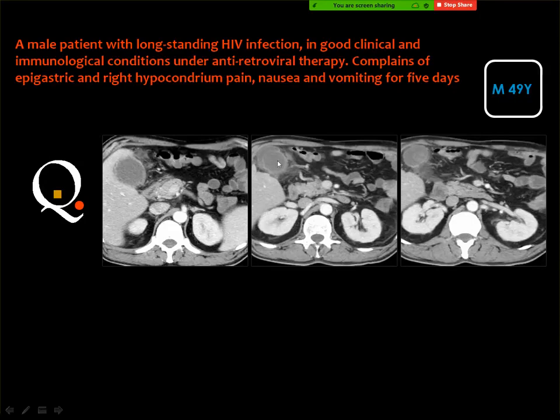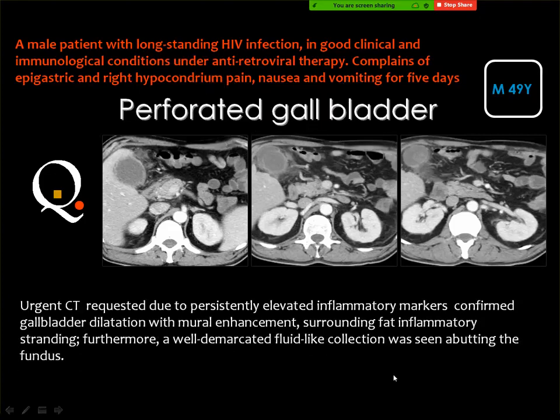No. The wall is not thick and does not contain cystic changes. But whenever you see this, if the fluid is circumferential around the gallbladder, this is pericholecystic edema. But if you see that the fluid is localized to a certain part and this is perforation, then you should consider that this gallbladder has perforated with leak in the pericholecystic area, and there is a possibility of developing biliary peritonitis.